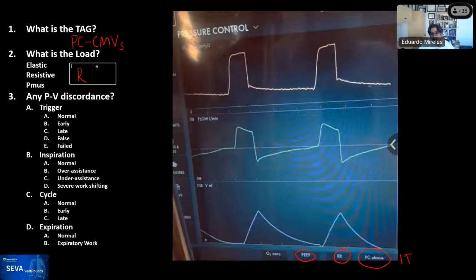Now you could say, well, Eduardo, could this be PMUS? Could this be the patient doing effort? There are a couple of hints, and you'll see on the next sequence how the waveform for PMUS will modify. But because these two are identical, unless the PMUS was identical, that goes with it. Then you'll see the expiratory time, the peak flow is blunted, and it takes several seconds to reach baseline with a concave form. So this looks like resistance.